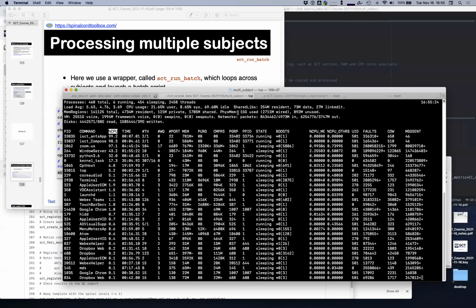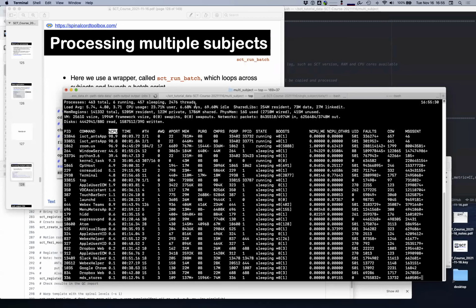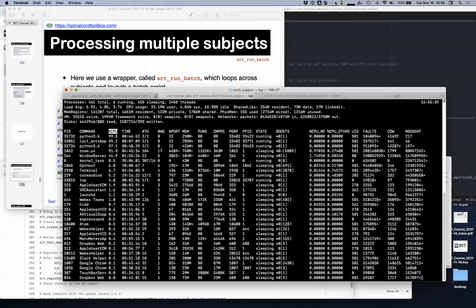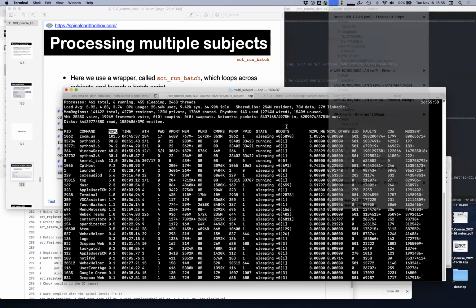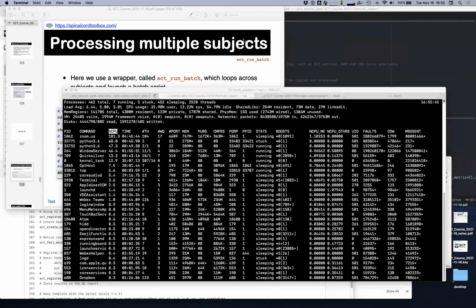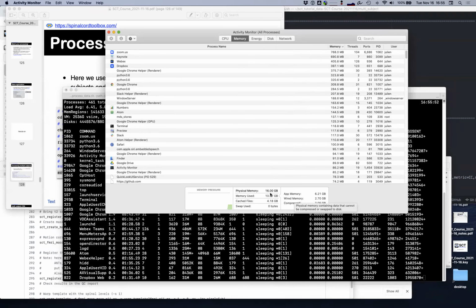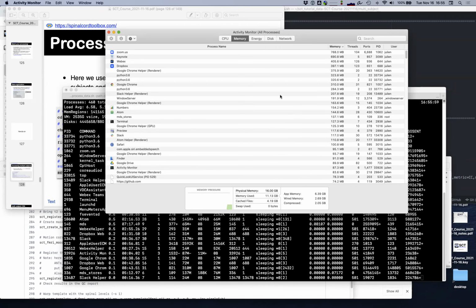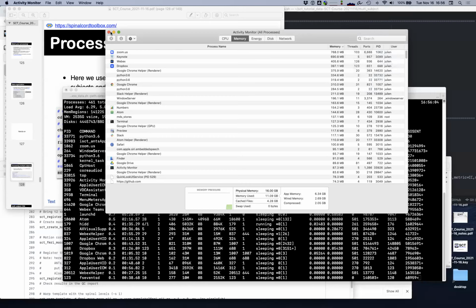So I have 16 gig in my laptop. You can see that it's actually, is that right? No. This is not a proper estimation. Actually, my RAM will be shown here. That's my processors. So I can use this. So I still have some room, right? And in terms of CPU, I probably use like half of it, so I still have room here as well.